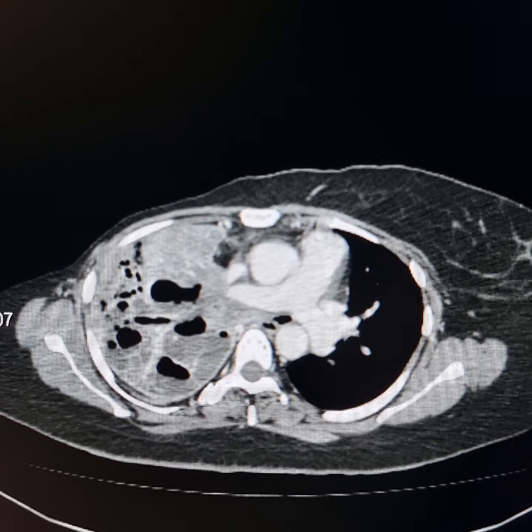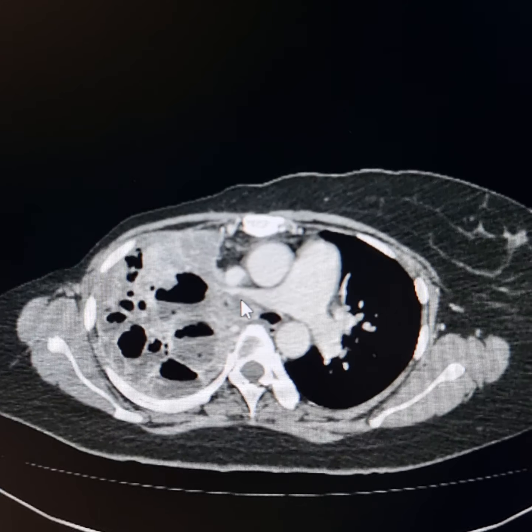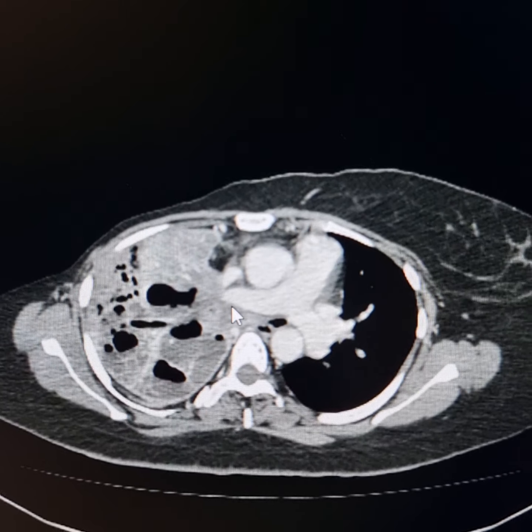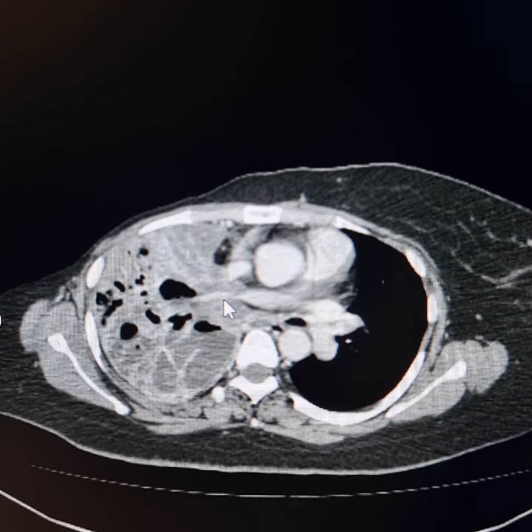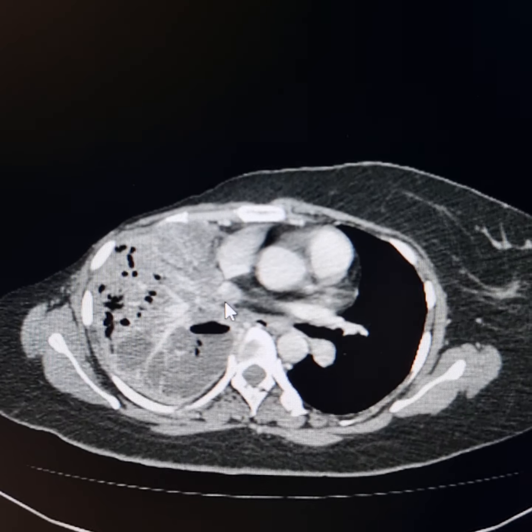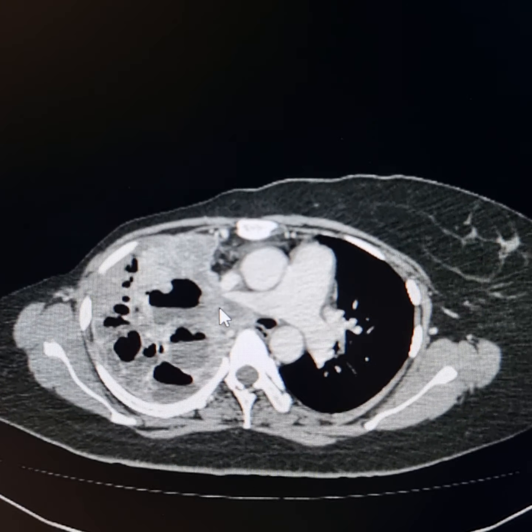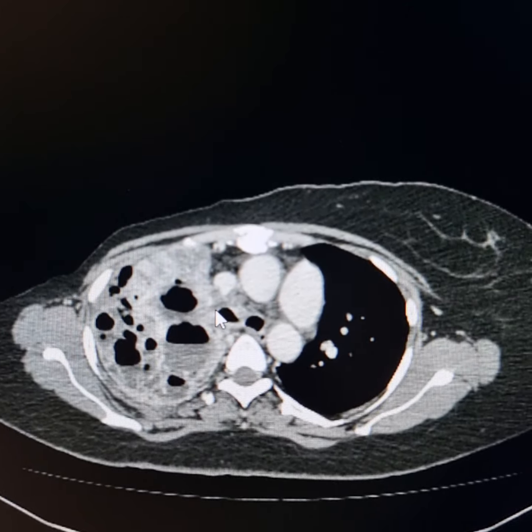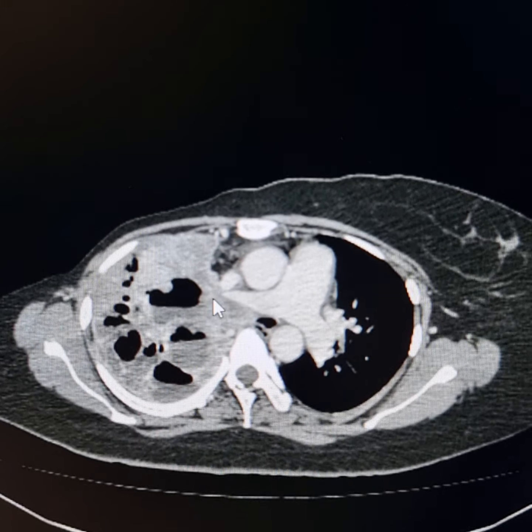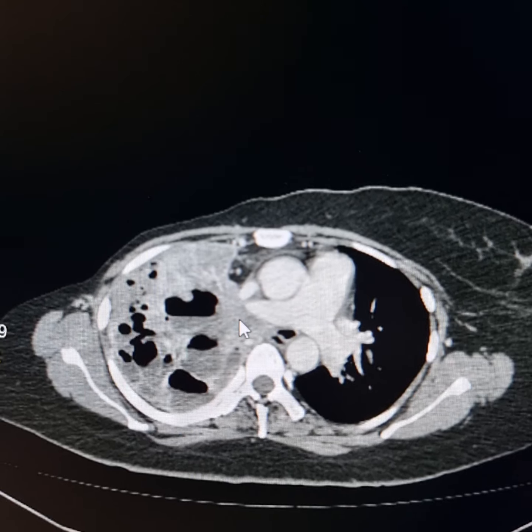But in this region, for example, you will find the mass has surrounded the right upper lobe branch of the pulmonary trunk, and the right lower lobe branch. Now these are narrowed. These are suggestive of the presence of growth here. If this was simple consolidation, then there should not have been any narrowing of these arteries. You just observe the right upper lobe branch of the right pulmonary artery, significantly narrowed. That means there's a growth here.